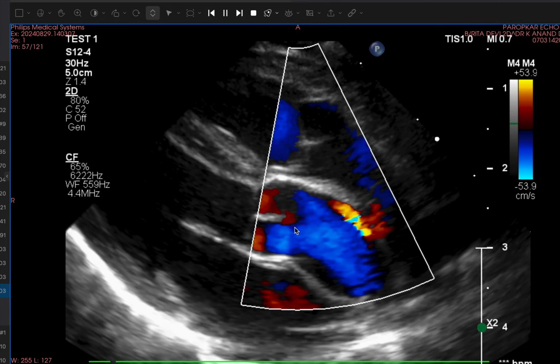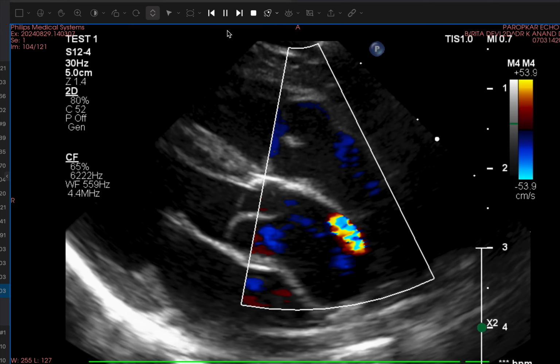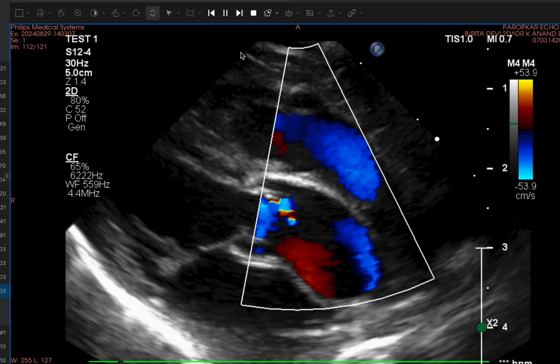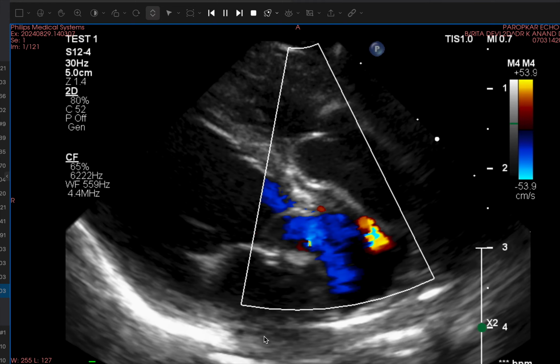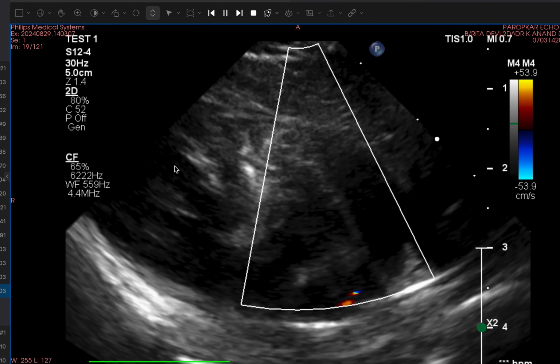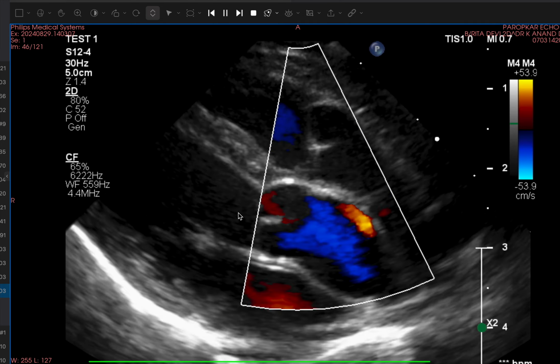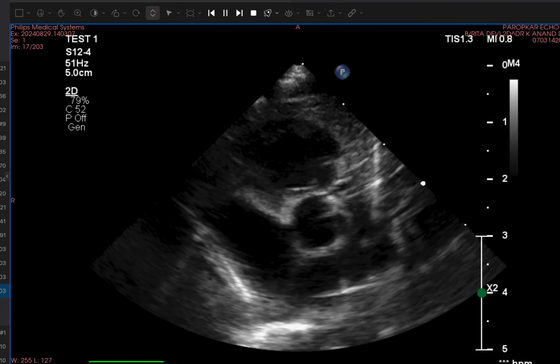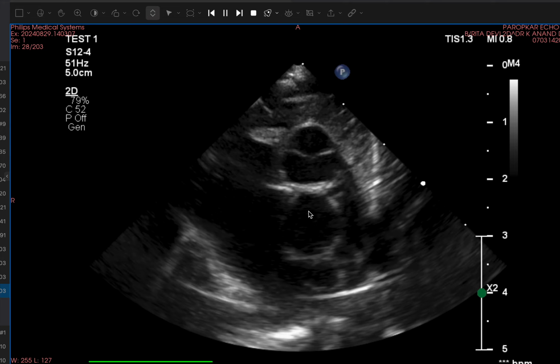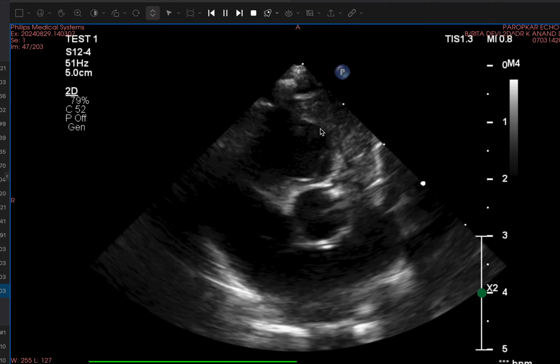That is the point through in this whole image. This is anterior part, this is most posterior part, this is superior part, this is inferior part. Image wise, this is parasternal long axis view. Again you see this is pulmonary artery and this is aorta.